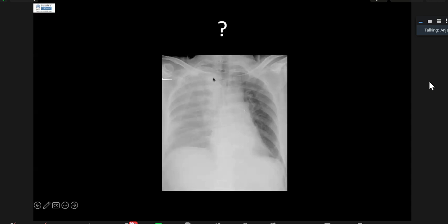On an erect position, when you're taking an X-ray, there is fluid both in the anterior pleural space and the posterior pleural space, which adds to the density. So this is an appearance that will give a hazy appearance to the hemithorax, but you are very clearly seeing the domes of diaphragm, the mediastinum, etc., and nothing else would explain this picture. Okay, so pleural effusion should have looked very dense.